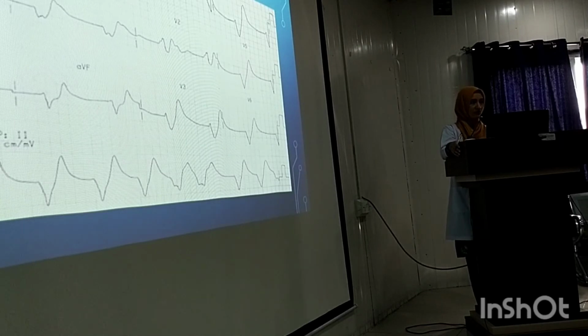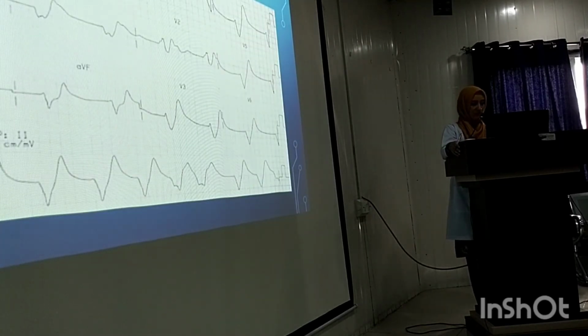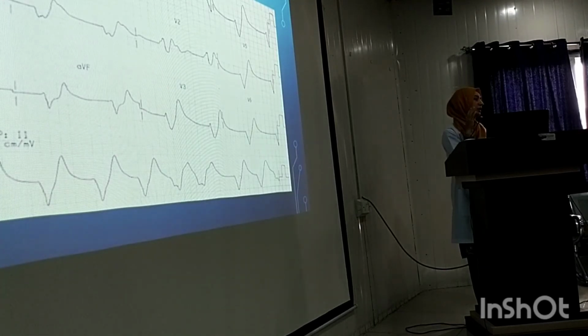I don't get a response, so maybe not really. This is a sine wave. This is a dying rhythm. If a patient has hyperkalemia in the range of 7 to 8, in the end the patient gets an ECG like this, and it becomes very difficult to do anything at this stage if the hyperkalemia is so bad.